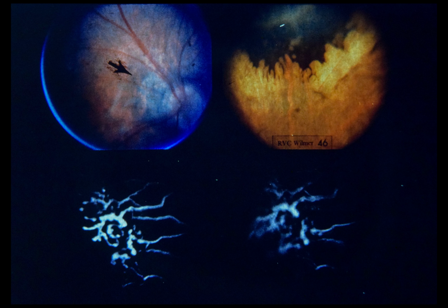Refraction revealed 10 diopters of myopia in the right eye. With glasses, visual acuity corrected to 20/200, right eye. Vitreal hemorrhage, left eye, limited vision to light perception only. Upper left, note myopic conus on temporal margin of disc. Upper right, in nasal periphery, posterior to equator, note large retinal scar.